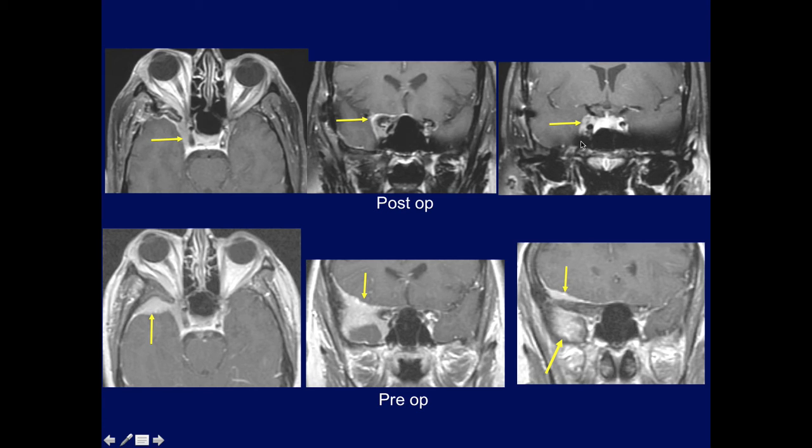As I said earlier, you cannot operate medially because you cannot operate on the cavernous sinus, because it's causing tremendous damage, entering the veins, bleeding, damaging all the nerves. So people usually will stop at this location. So this is the remnant of a large meningioma. This is not de novo, this is just a residual.